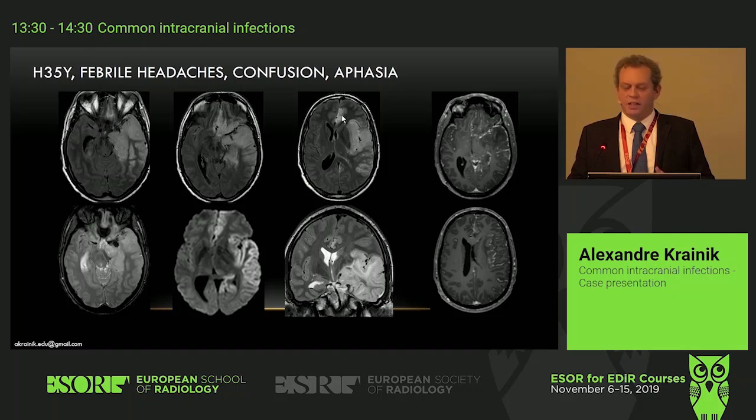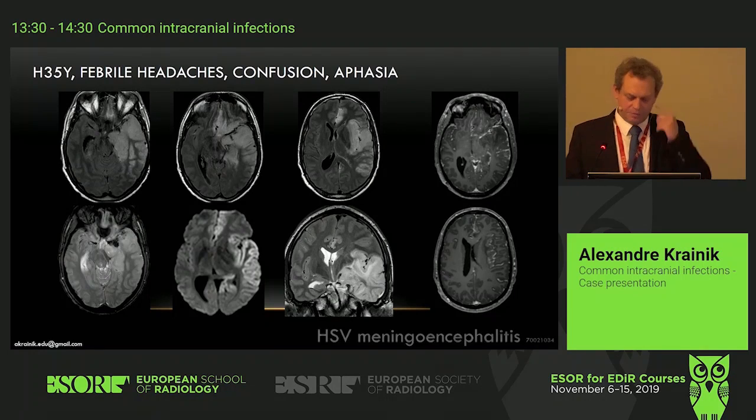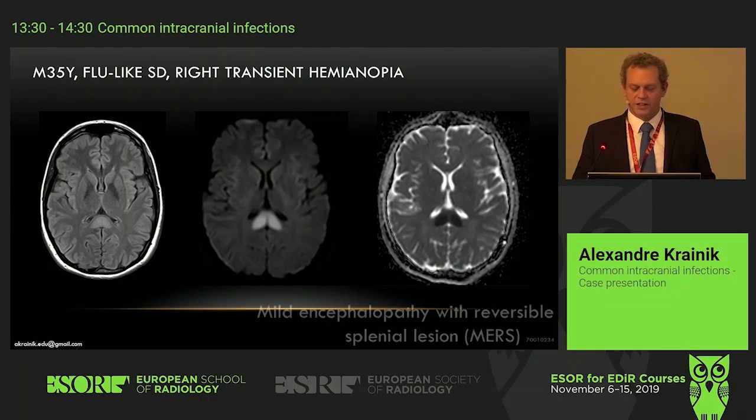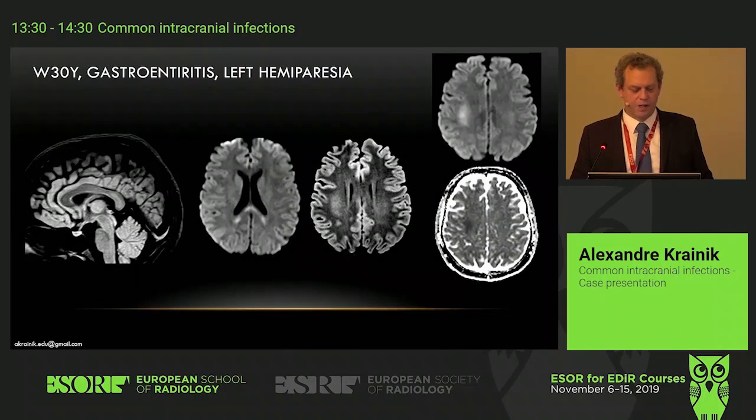I mean, they're different. It could be something else. It could be a different virus sometimes. But it has to be considered as herpes until they demonstrate it's not, and he has to be treated as if it's herpes, and actually it was. This was the case I showed you.